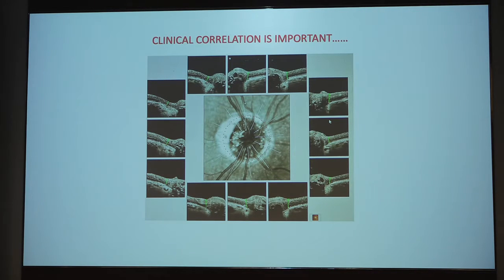Now here you can see all the sectors are green. Even though all the sectors are green, it doesn't mean that everything is normal, because this is just an image. This is not going to give you an answer. This is going to help you answer.